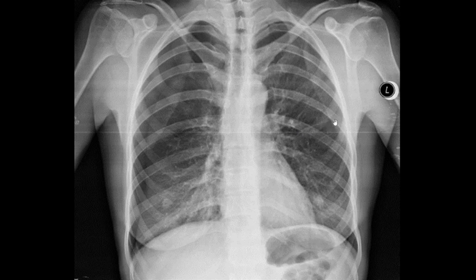So maybe it is hard to see here, but once you look at X-ray images, you will see, if you look close enough, that even here on the whole periphery of the lung, there are small whitish markings that represent these vascular markings. And it is always important to look for them and to see if they're present all the way from the basal part to the apical part.